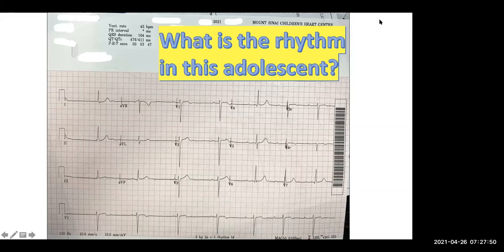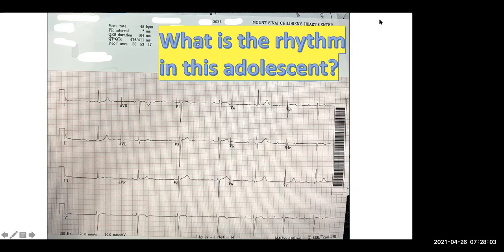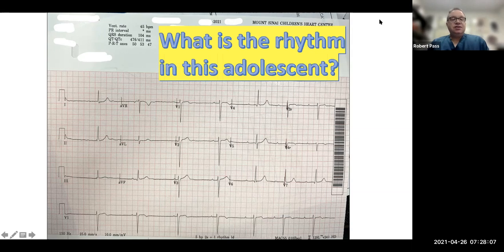Sick sinus node syndrome, I would call it. Intermittently bradycardic with intermittent junctional rhythm. Okay, and what about the conduction when there is conduction? First degree heart block when there is conduction. Right. So I would say that this is someone with sinus node dysfunction with some junctional rhythm and then first degree heart block.